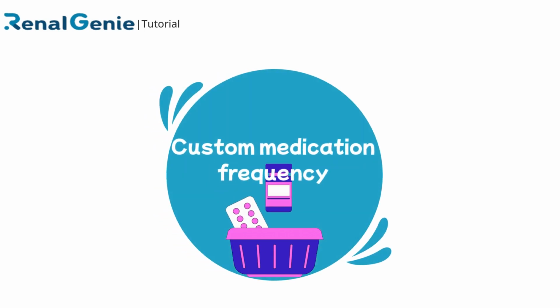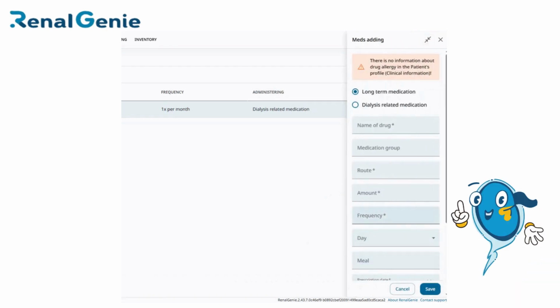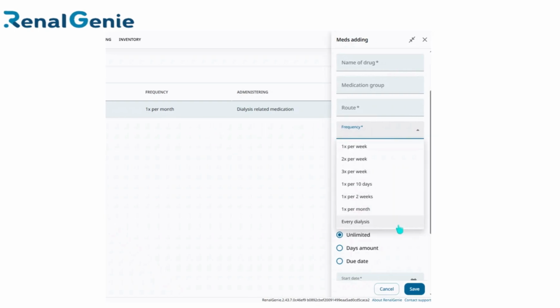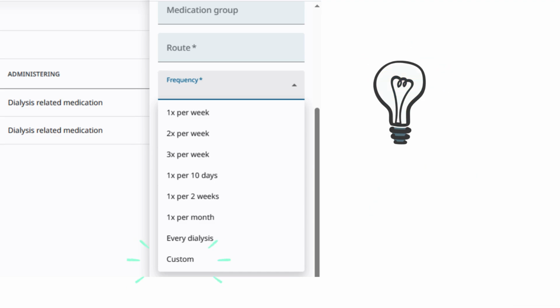This is a video about custom medication frequency. Our previous medication frequency options might not have given you the flexibility needed for your patients. But worry not. Now, you can fully customize the medication frequency to match each patient's unique treatment plan.